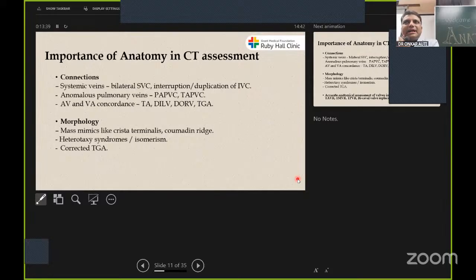So in this particular anatomy, as your right ventricle is giving the blood to the systemic arteries, it is already hypertrophied. Okay, so you will not be able to make a diagnosis on the basis of muscle thickness only. So you have to know that there is a moderator band over here, and this is a morphological right ventricle, and this is a morphological left ventricle.